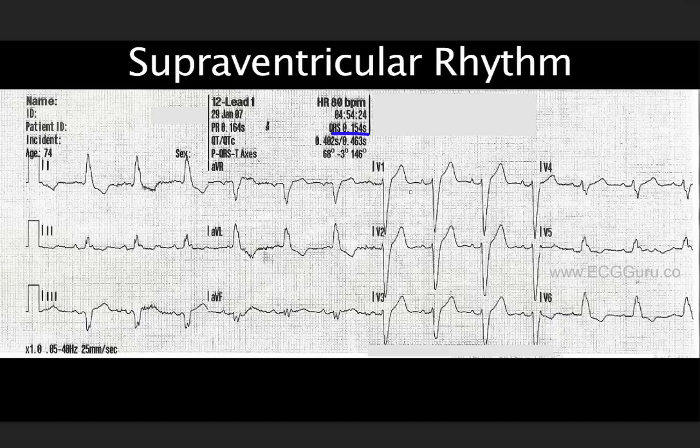So one criteria for having any bundle branch block, left bundle branch block in this case, is supraventricular rhythm. There are a couple of supraventricular rhythms you need to remember that don't have P waves. P waves are nice, they make it easy, but junctional rhythms don't always have P waves, and atrial fib doesn't have P waves. Also, if the rate gets really fast, you may not see the P waves because they're buried in the T. Those situations can make it much harder to recognize left bundle branch block, because in order to recognize it, you have to meet the criteria. So the two we've talked about so far are the wide QRS and the supraventricular rhythm. And the supraventricular rhythm, in this case, we can recognize by seeing P waves.